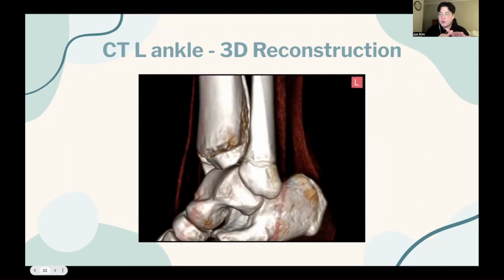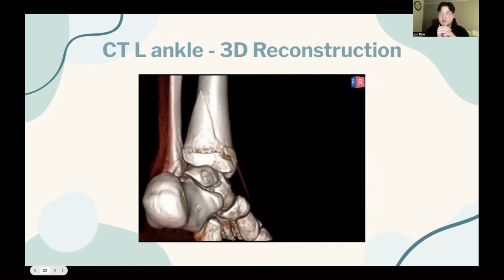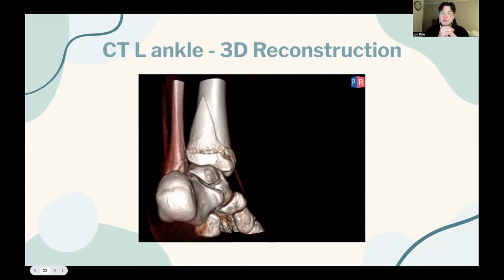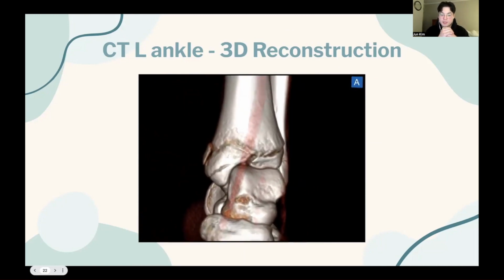Starting from the front, we see the obvious epiphyseal plate fracture. Going posteriorly, we see the extent of the oblique fracture and the avulsed medial tibia. Coming back around, we see the transverse fracture of the medial malleolus.